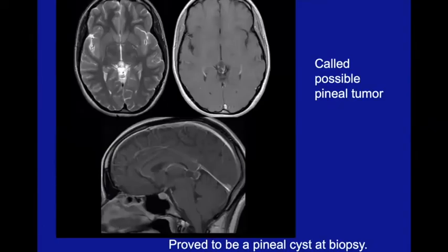Now, in this unfortunate case, you can see that this is a complicated, here's a pineal cyst, less enhancement, a little internal structure.